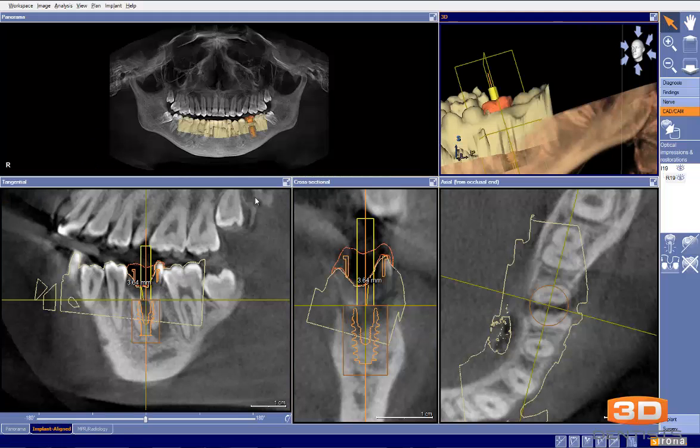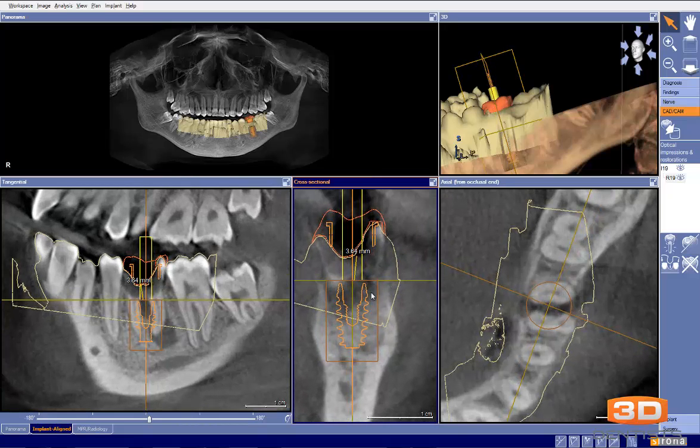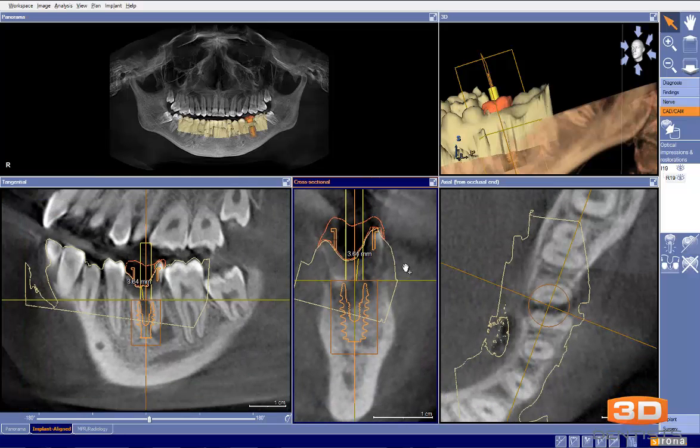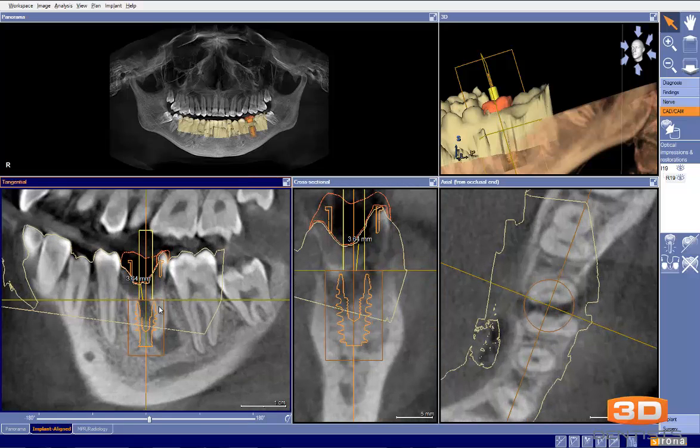in this particular situation. First, let's evaluate two things. One, the implant plan itself, and then we'll come back to whether or not this is a good case for immediate. So let's start with evaluating just the quality of the implant virtual planning in of itself. So here, if we take a look at it, buccolingually we're good, mesiodistally we're pretty good. Bone level, it's questionable. We're right at the furcation, which is our typical starting point for implant planning.